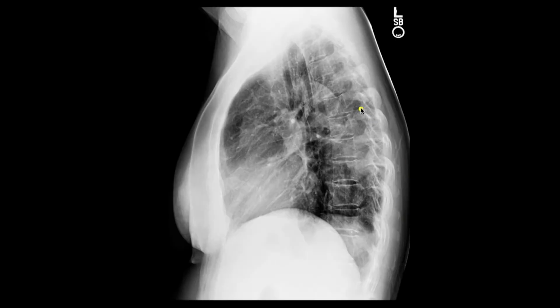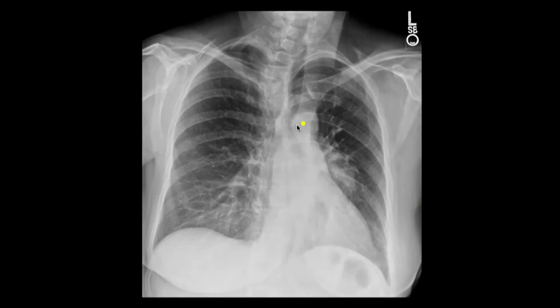And on the lateral view, you can see this large irregular mass here. So I'm just going to outline the mass for you. And this was a large lung cancer, which was very difficult to appreciate on the frontal view, simply because it was projecting over the hilum. So the mass was largely sitting behind the heart and made it very difficult to visualize. But again, this hilum is enlarged, and that was because they had a mass sitting behind that.